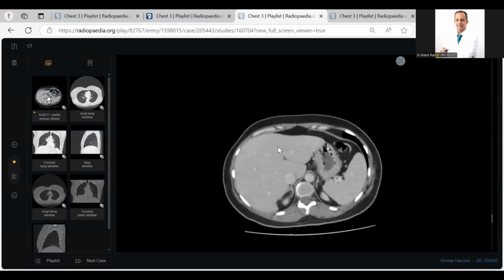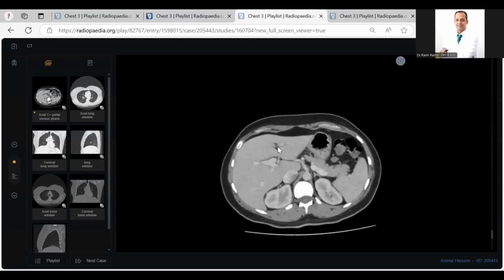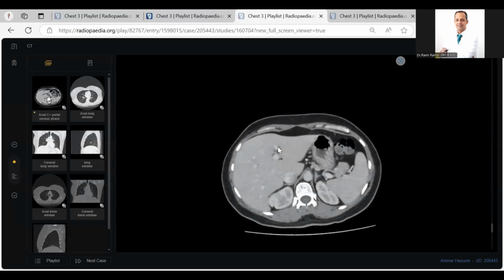Frankly, when you see few bilateral, small, hypodense, non-enhancing renal lesions, it most probably represents angiomyolipoma. However, I want the non-contrast to measure the density. If it is a minus measurement, it is fat, and I will confirm my diagnosis. Very excellent. Then if you want to tell me, I will do family screening, I will do brain MRI, all of this, I will be very happy.